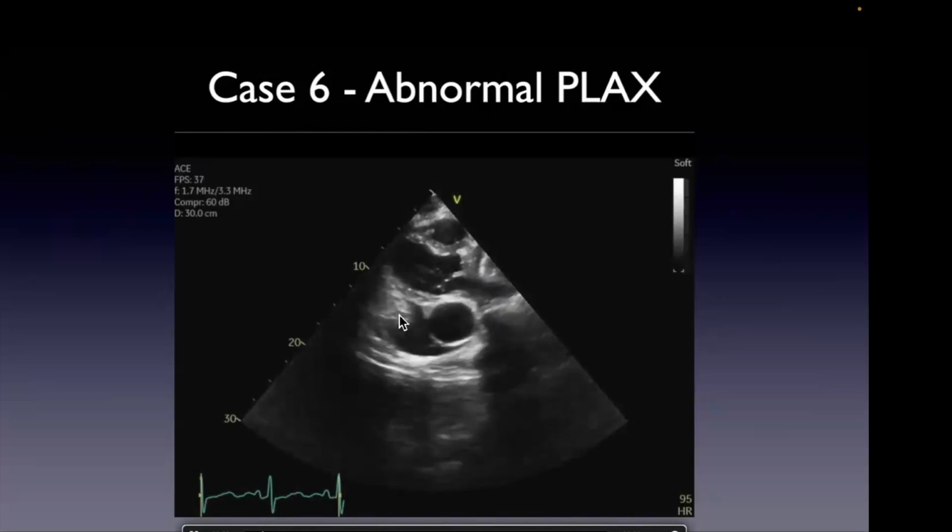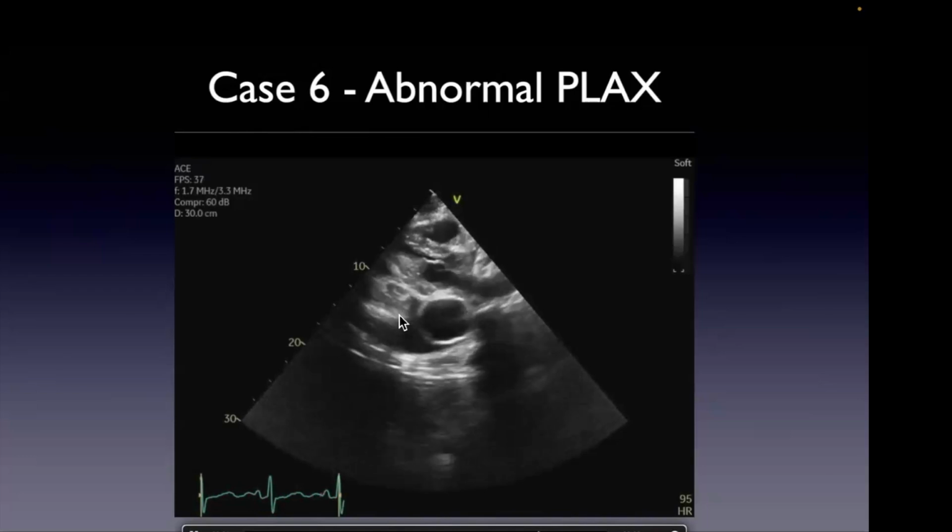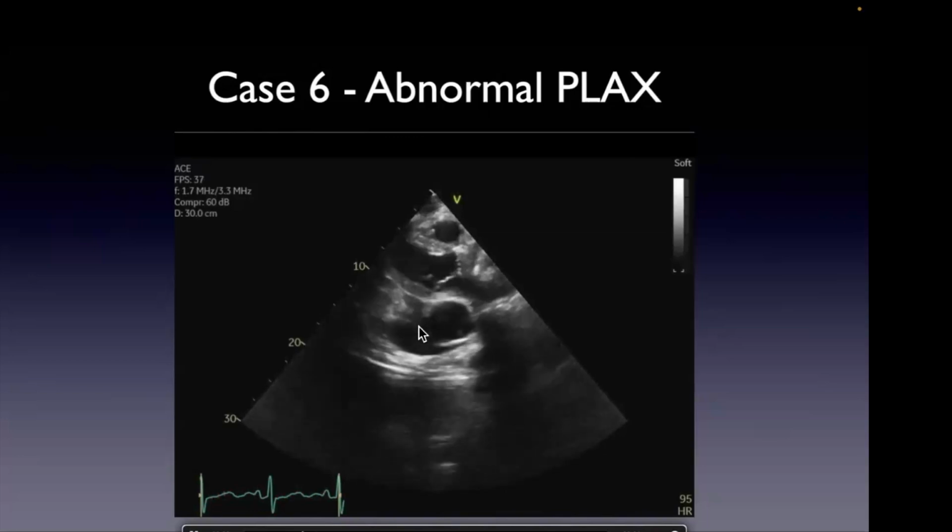is you can get more long axis views. So here there's more of a short axis view of the descending thoracic aorta. Remember, the descending thoracic aorta marks whether this is more likely a pleural versus a pericardial effusion. This looks more likely a pleural effusion. So what are some of the views where we try to see the descending thoracic aorta in long axis? Two-chamber view is pretty common. And another one? Short axis, right?